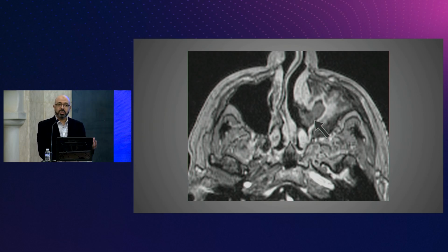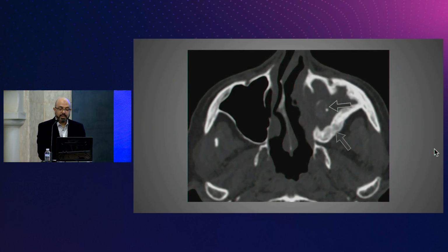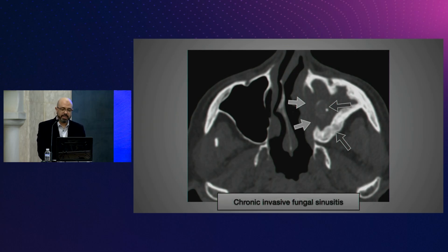Why is this patient coming with epistaxis? The fungus has gone wild. Can you see the medial wall of the sinus? It's eroded, and this is what we call chronic invasive fungal sinusitis.